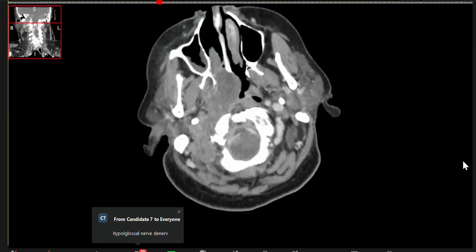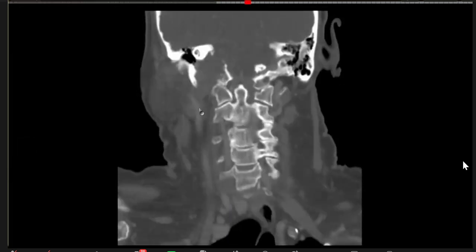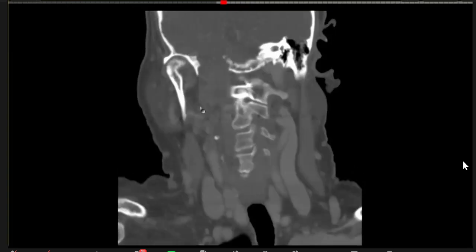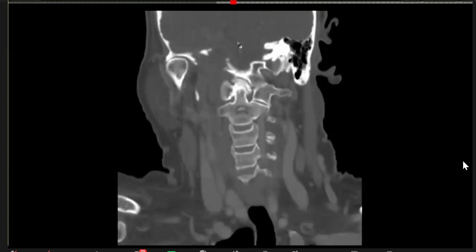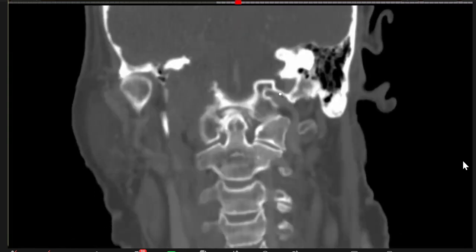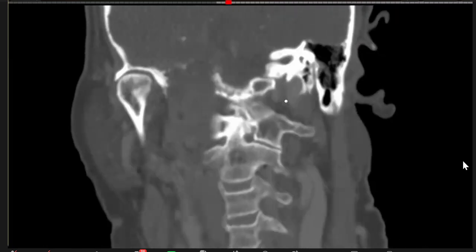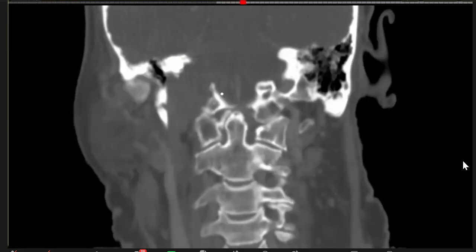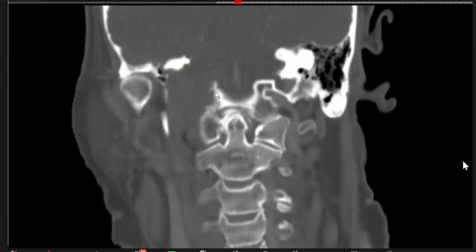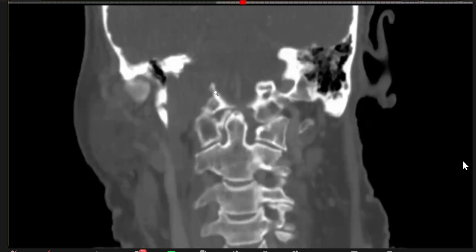And then we go to here. If you go to the coronal sequence, which is this one, look at the anatomy, you look for that eagle. This is the eagle. Mr. Eagle is sitting here, and this is the beak, right? This is the normal side. So this is the hypoglossal foramen and then the canal, and this is the eagle. Where is the eagle? Gone, destroyed. And in the exam, I'll show you a coronal and ask what is happening to the jugular tubercle. Where is it? What is happening? So you have to tell me.